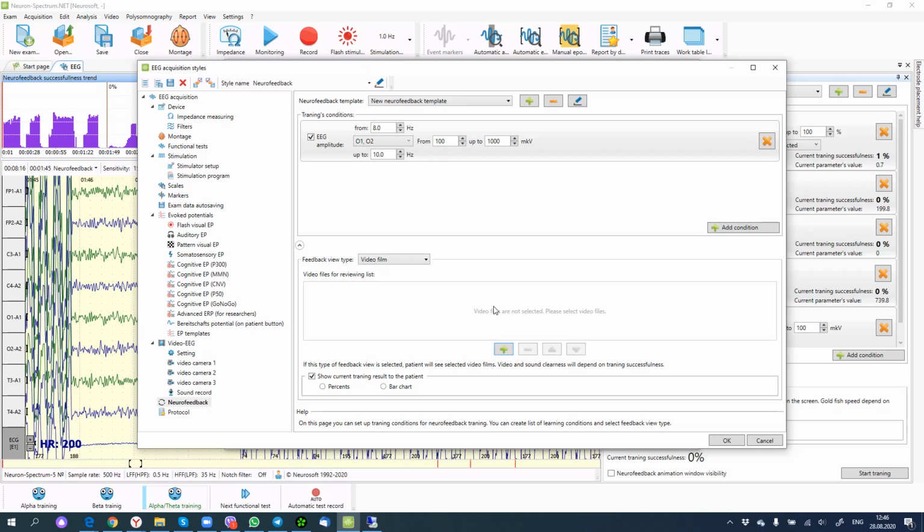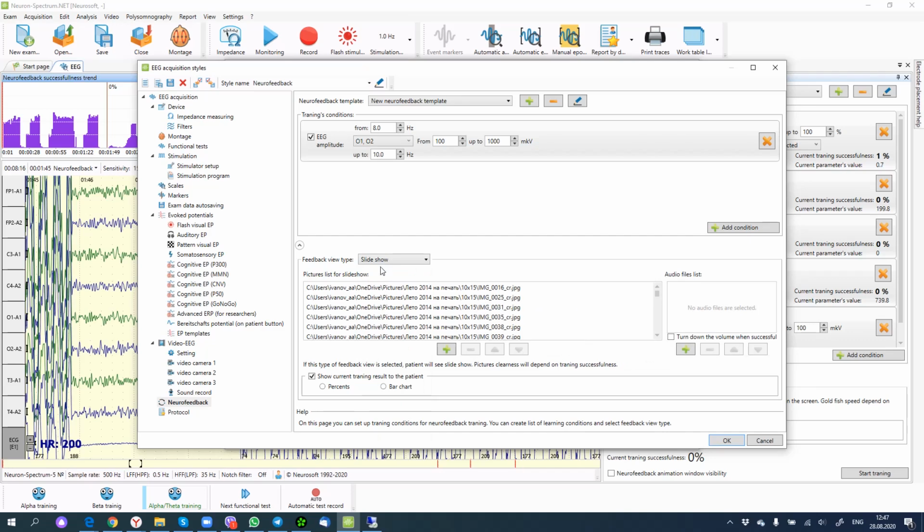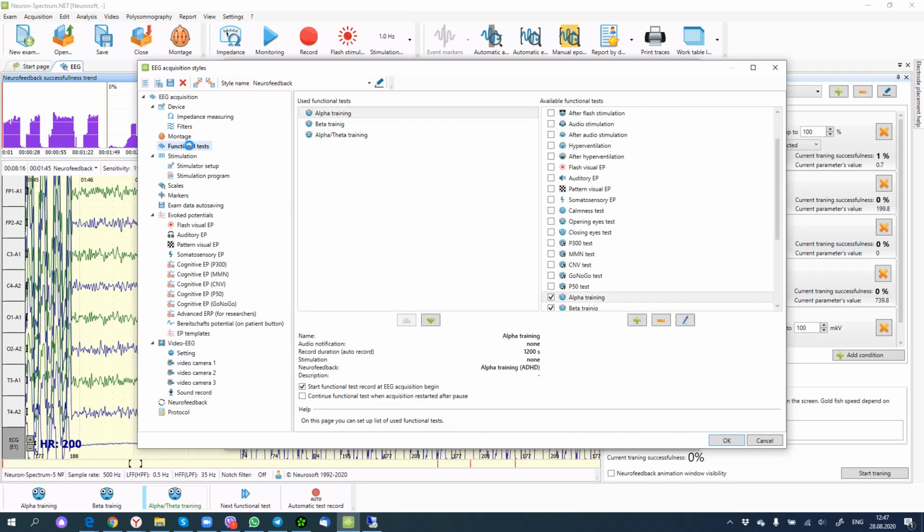Upload some video which will be interesting for this patient, and also we can set up showing results of training in a figure or as a bar chart. Okay, let's save this like this.